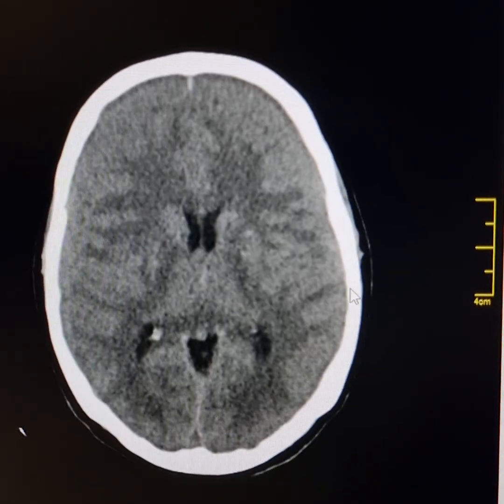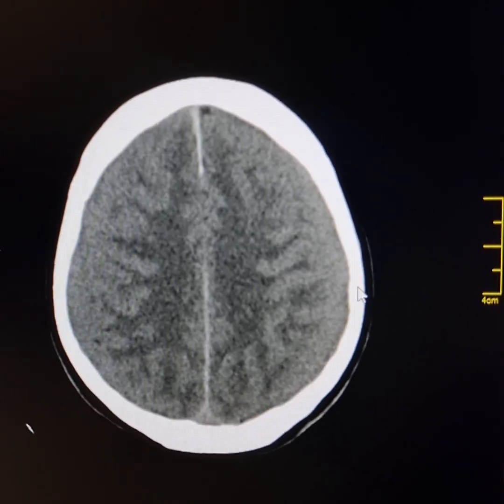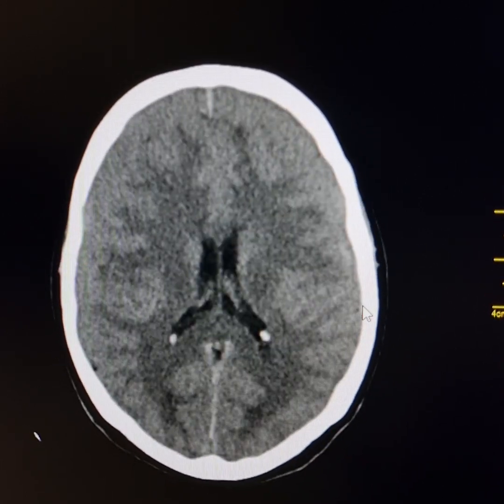These may be very difficult to differentiate, so the answer is a contrast enhanced CT scan or obviously MRI, and there is quite marked cerebral edema.